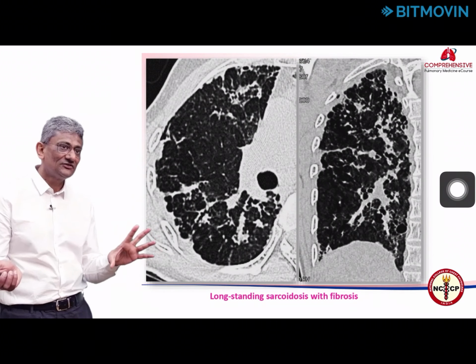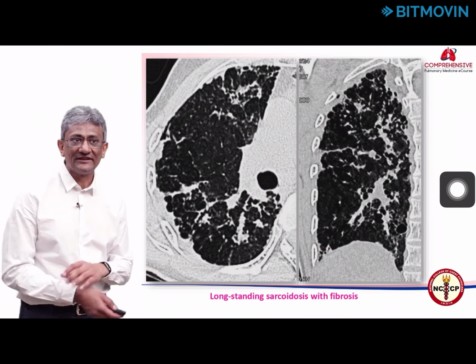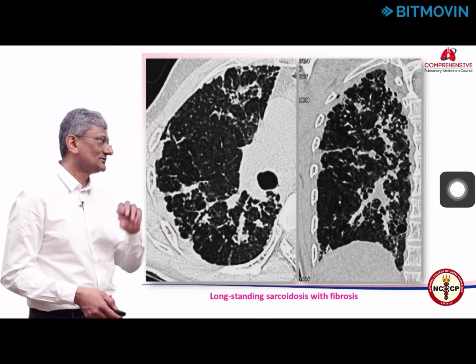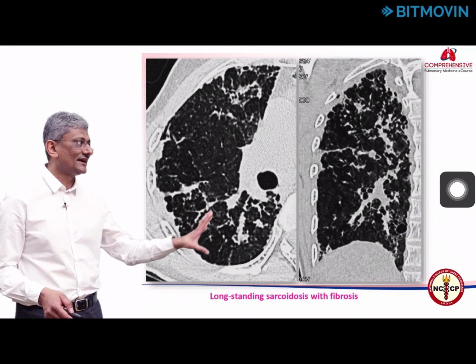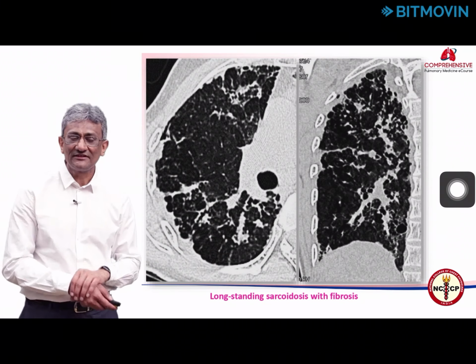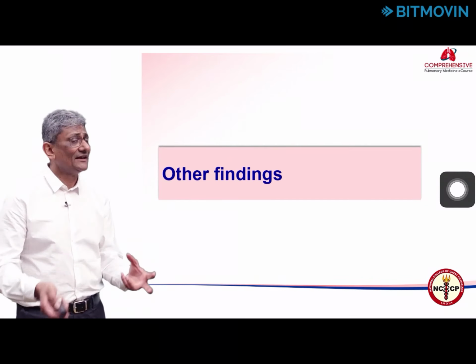Like with chronic HP, sarcoid that is not treated well or does not respond to treatment can then undergo end-stage fibrosis, and it will look like the inconsistent with UIP pattern with band-like areas, some ground glass, traction bronchiectasis, not subpleural, not basal. That is not as common as chronic HP, but also a diagnosis that you would have to make.